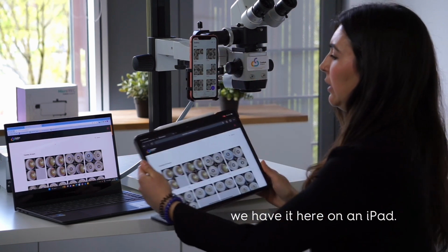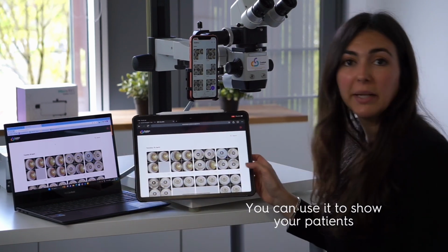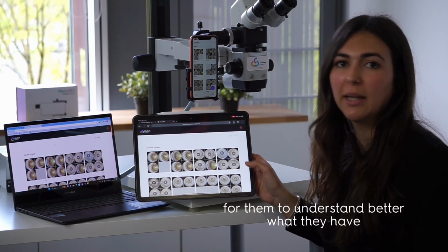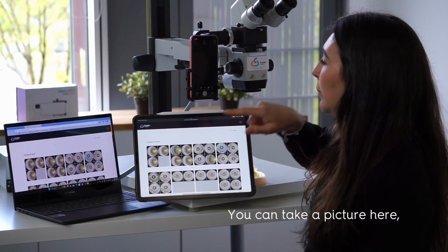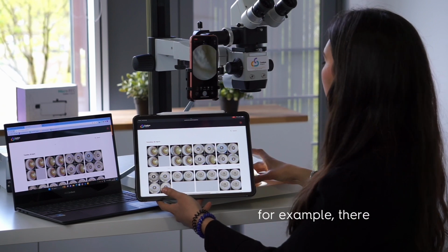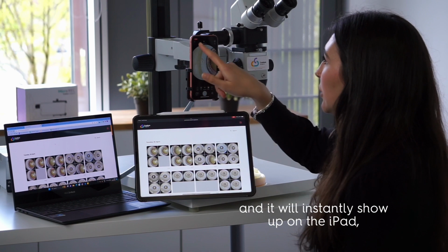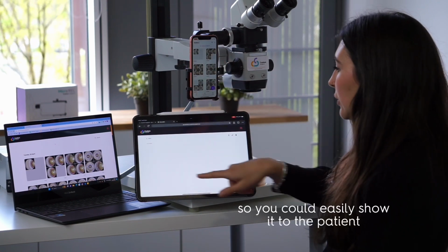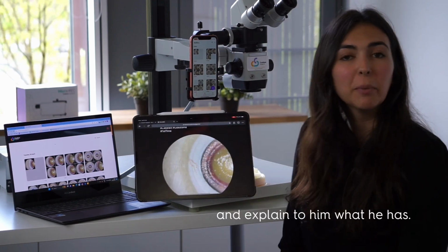For example, we have it here on an iPad. You can use it to show your patients the images of their own eyes for them to understand better what they have and to see it easily. So you can take a picture here, for example, there. And it will instantly show up on the iPad. So you could easily show it to the patient and zoom in and explain to him what he has.